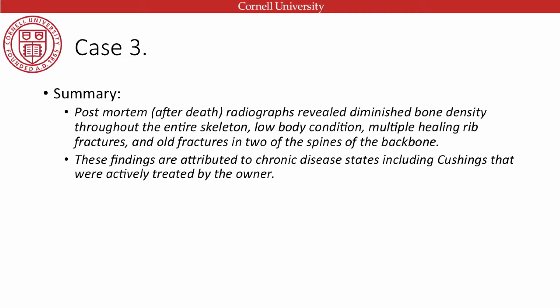No, it's interesting. I thought it was an interesting case because that imaging really helped identify that, okay, we don't have a normal bone here. We have a dog that's probably got chronic disease. She's old. There's a few other things, the fact that she had a history of pelvic limb issues, so maybe she's not walking around so much. We've got diminished bone density going on. So these all help push us towards a diagnosis that's leaning towards, okay, these fractures could have just happened spontaneously as a result of the bone quality rather than an abuse situation, which is helpful.